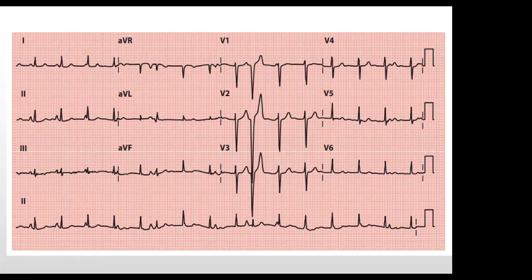So I think one thing clear in this ECG is that you're having multiple morphologies of P wave, which defines the fact that it is coming from different sites. And if you look at this other part, you can see some ventricular complexes. So if the heart rate is more than 100, it fits perfectly into multifocal atrial tachycardia. But if it's less than that, you tend to use the term wandering pacemaker.